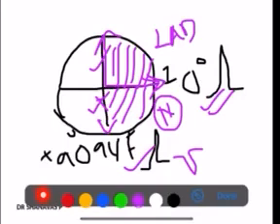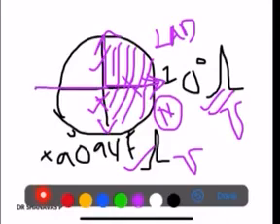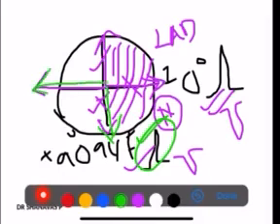Assume another ECG where the direction of lead 1 has changed, so instead this will be lead 1, but aVF remains the same, that is, the same positive QRS. The aVF direction is this, but the lead 1 direction has changed. That means the axis lies here, that is, it has a right axis deviation.